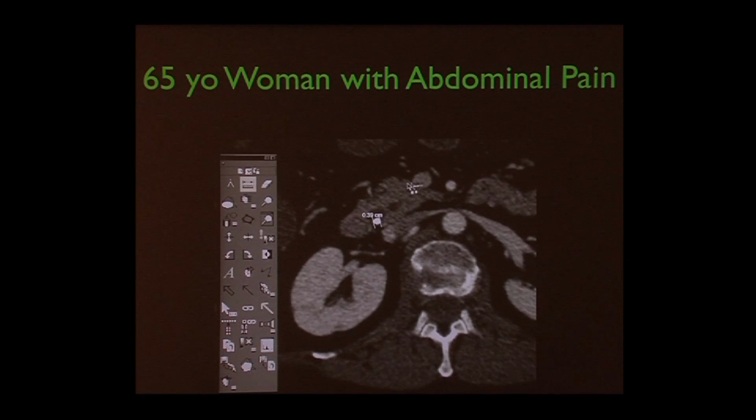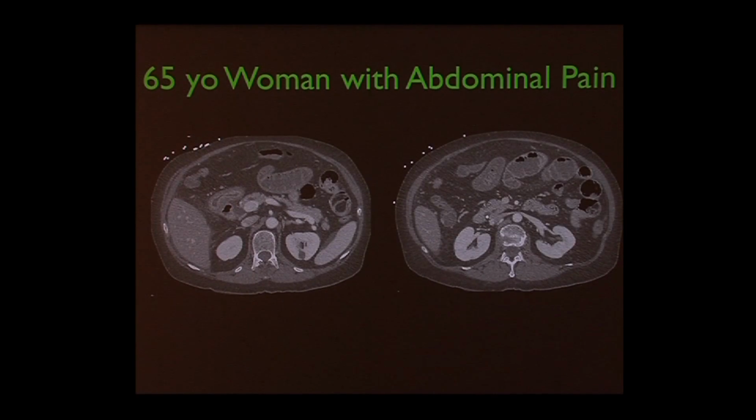Wow. Here are some of those still images I mentioned. That wasn't her only problem, actually. She also has very thick-walled bowel. There, for instance, and here's the obstructed bile duct, and it's below this that the stone was present.